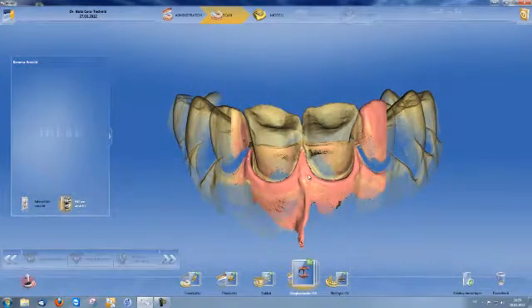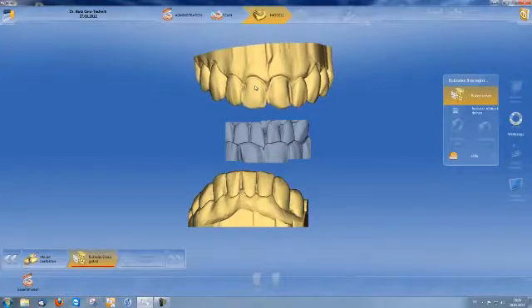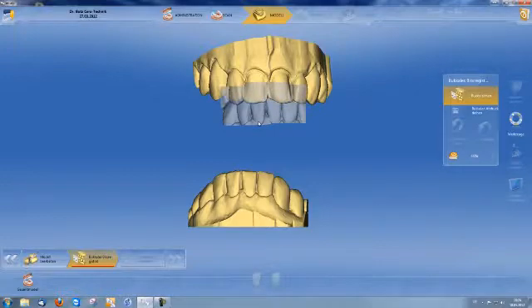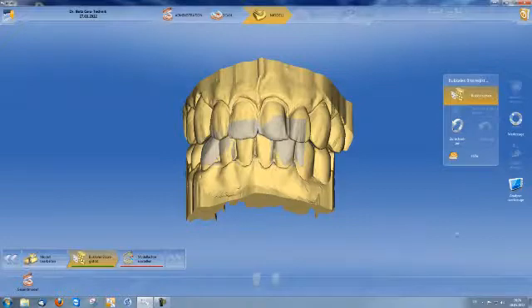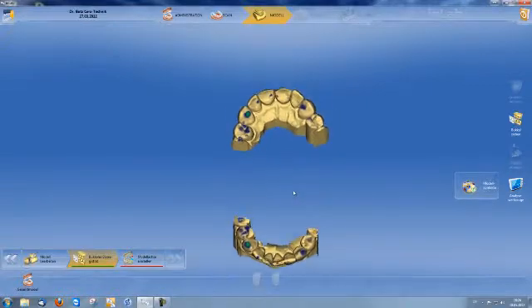Once the scans are complete, I go to model mode. The first step is registration of the upper and lower jaws. If the buccal scan is rotated through 180 degrees, I click on the bottom of it, i.e. on the lower half, and move it upwards using drag and drop. This causes the buccal scan to turn round, and I can register both jaws. I can now check my model contacts using the analysis tool and see whether these correspond to the articulator.